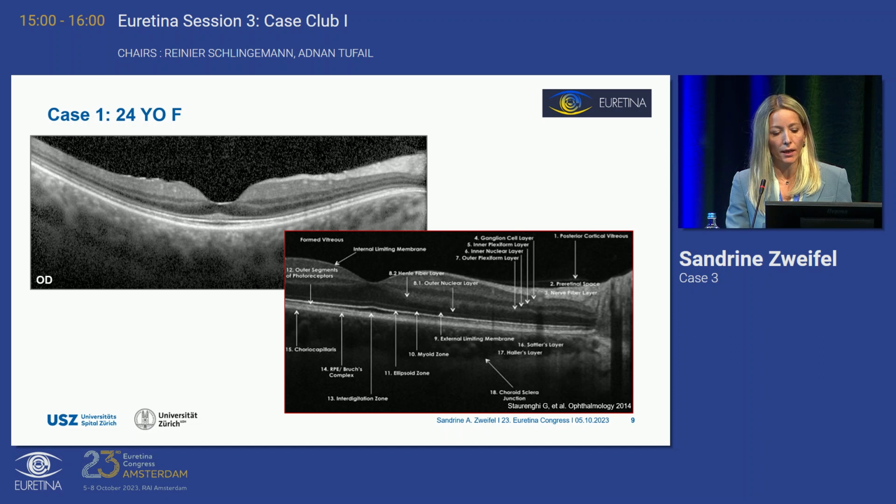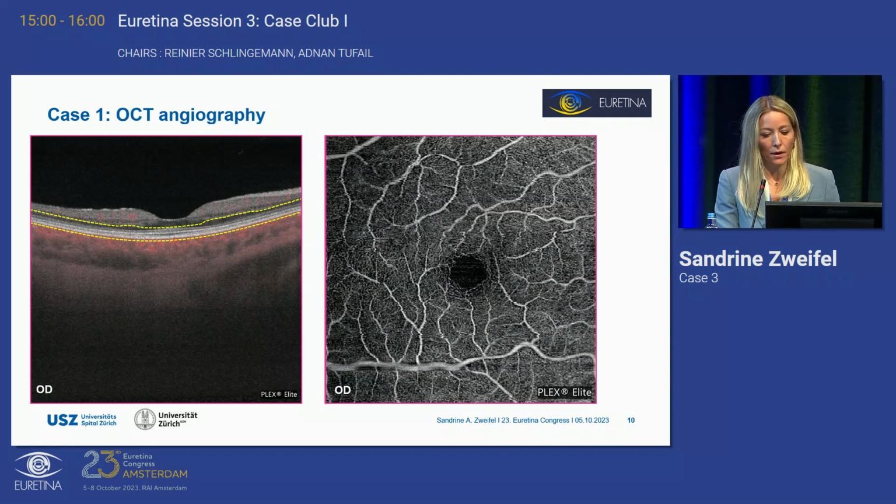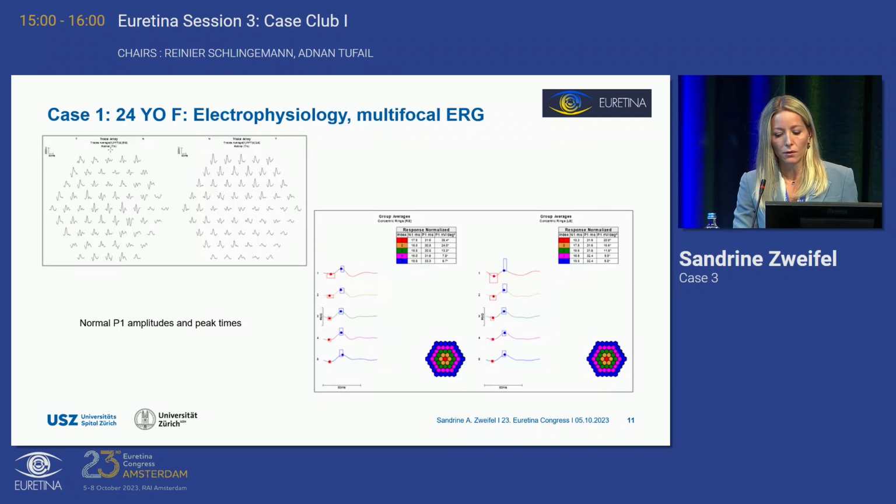I just want to mention again, there is not only in the center of the macula this hyperreflectivity or thickening, it actually also spreads to the periphery. So you already heard the diagnosis. I give you some further imaging. So this, of course, is not a vascular problem, but it is an underlying systemic disease. So the eye acts here as a window for the underlying systemic disease.